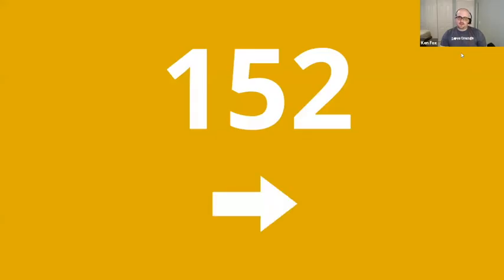Very simple, it creates a color in your threshold if you're above your target. Again, same color as the dots. Changes the color, tells you what the current arrow is and the current blood sugar. This is useful if you want it up on a computer screen or an iPad, or I actually should have a picture of it, sorry. I know I do have one.